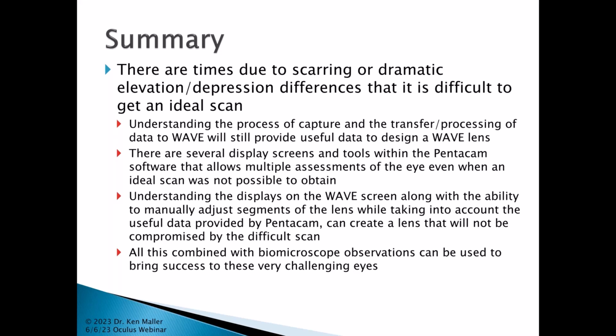Understanding the displays on the wave screen along with the ability to manually adjust the segments of the lens while taking into account the useful data provided by Pentacam, you can then go ahead and create that lens that's not going to be all that compromised even though you had a difficult scan. And all that combined with your skills at the biomicroscope, you can go ahead and bring success to these very challenging eyes.